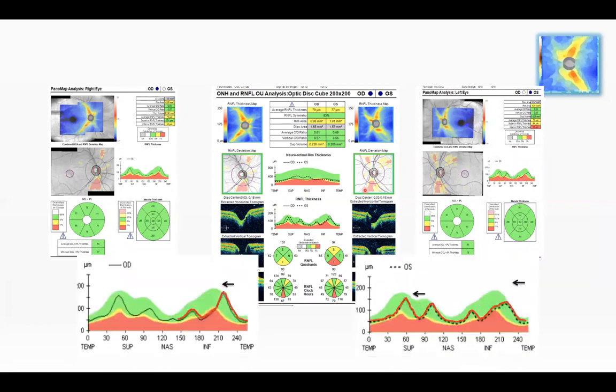And when you look at the TSNIT plots, you see RNFL thickness is quite good, but the RNFL pattern does not fit the expected normative database areas. Look, it's in the red here. If we move the TSNIT maps to the left or nasally, we will see that RNFL thickness will fit the green area for both eyes.